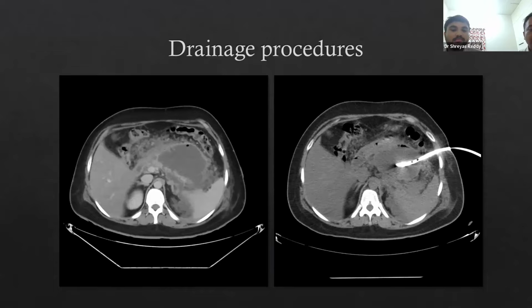Okay. So Shreyas, coming on to some other things, what do you see? There is some other thing also which is seen in this CT image. What is that? There are some inflammatory changes around the pancreatic region. And there is mesenteric omental inflammation also noted in there. So be specific when you're telling.